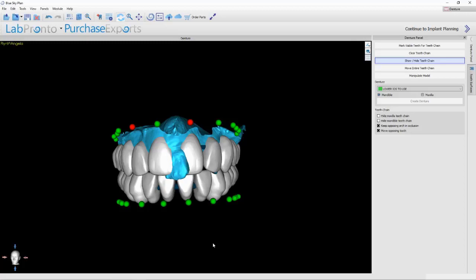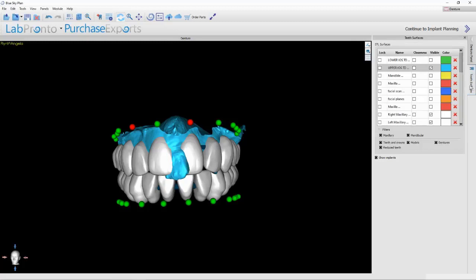Alright, that's it. So granted, I know with what I'm showing today, you need a facial scanner, or you need to utilize the pictures. Now anyone can do the pictures. Yes, the facial scan is going to cost money, but again, I think it's a really valuable tool. If you've got that, you can just see everything that you need to see.